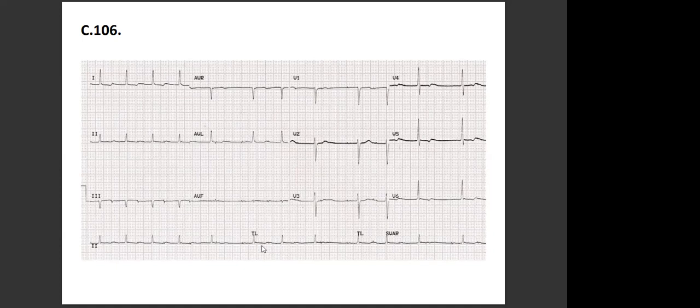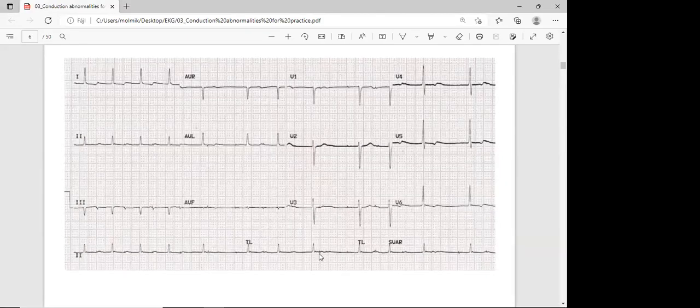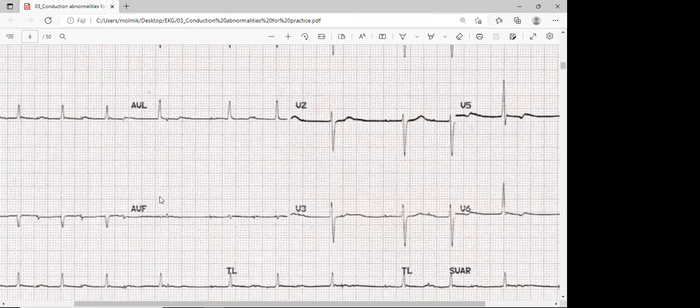Hopefully nobody. Yes? Now, if nobody has it, I will tell you what it is. First of all, if you look at the rhythmicity, it's not rhythmic. Only one problem: we do not see any P wave. Instead of a nice P wave, we have spikes. Can you see the spikes? So that's an atrial pacemaker.